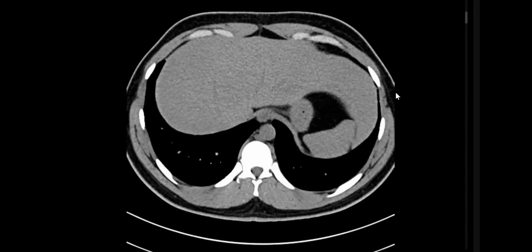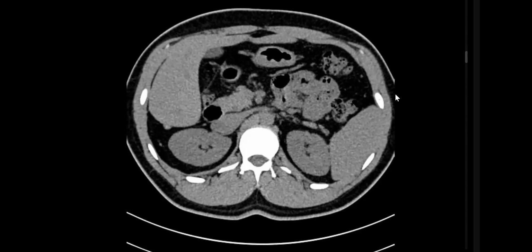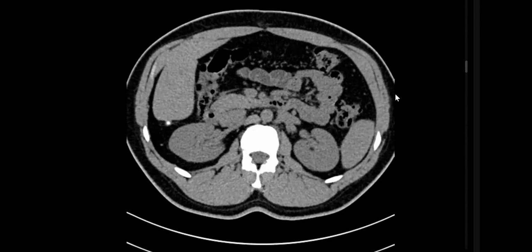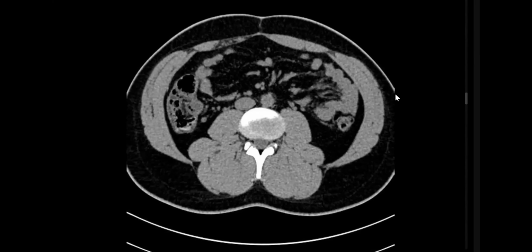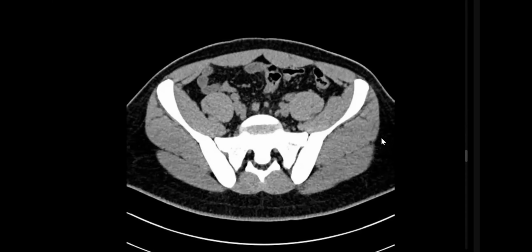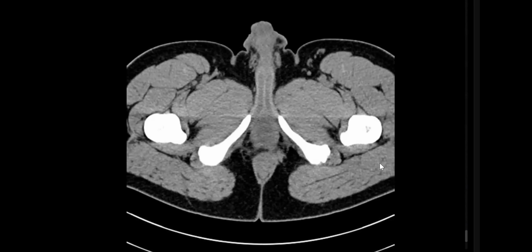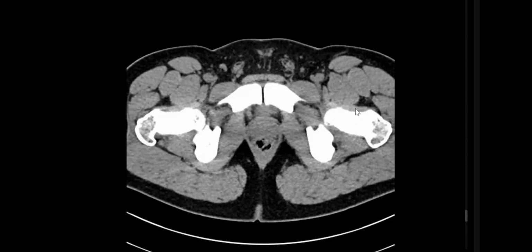This is a CT abdomen. This is a non-contrast image. I have seen the abnormality, but I would like to see from top to bottom, and then I'll start commenting. In my normal practice, I go till the last cut so as not to miss any pathology.